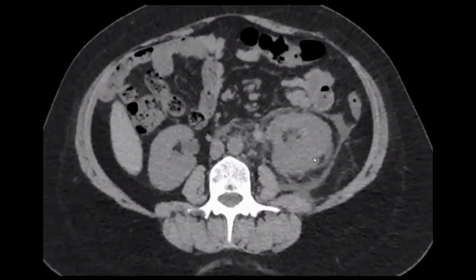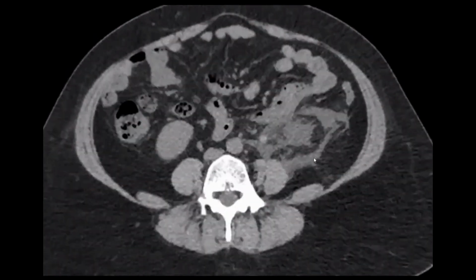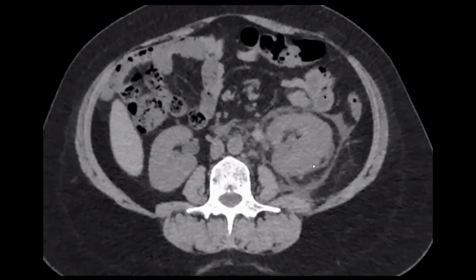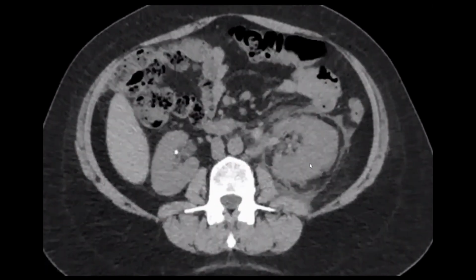Can you move down, please? I think it's in the pelvic calyceal system. Do you think this one is inside the ureter? So maybe. Can you scroll downward a bit? No, it's not the ureter.